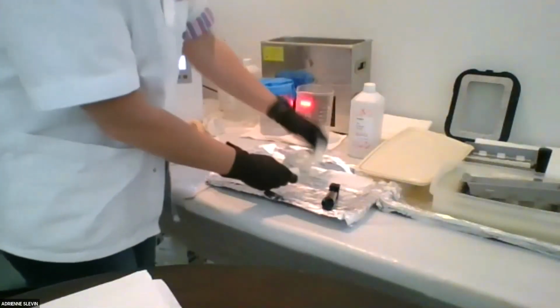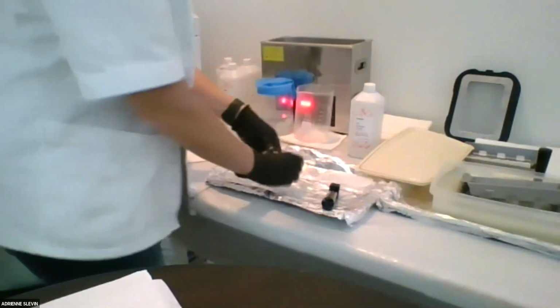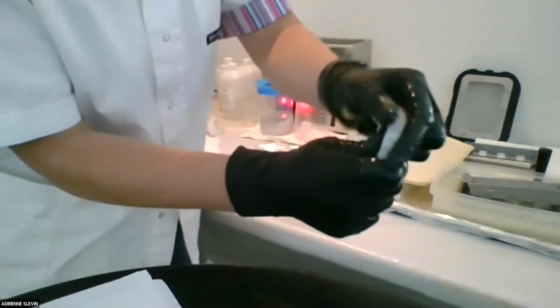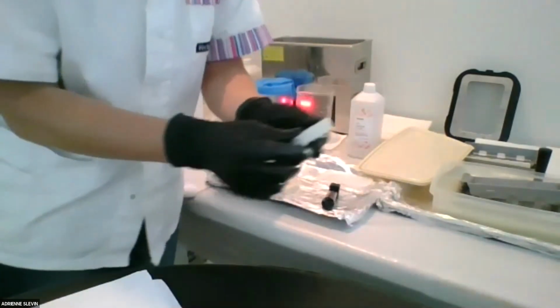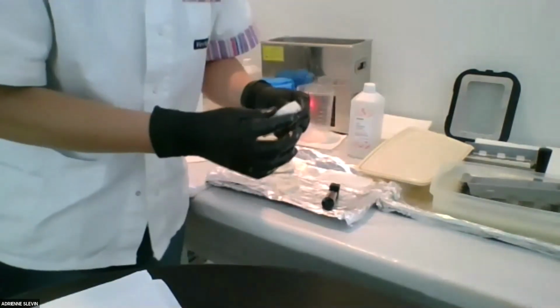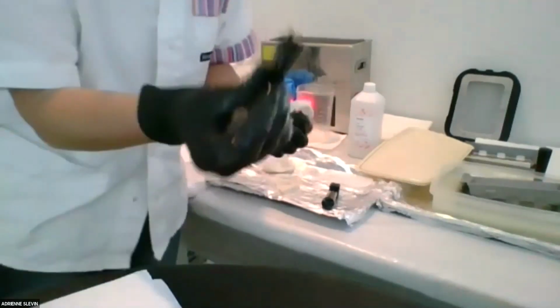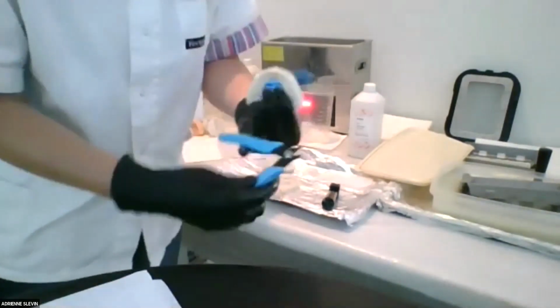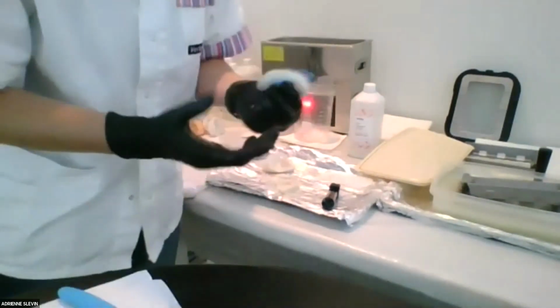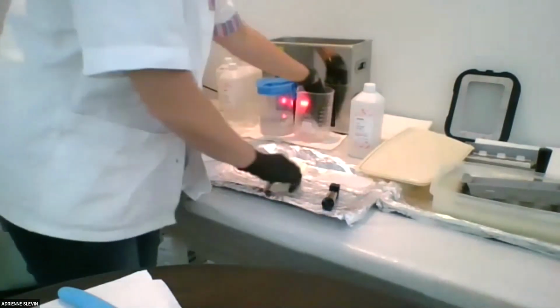So then after you do that, just put everything, don't mix, like, if I was doing model peach or something like that, I wouldn't put my bleach MFH in there, okay? So you can see, I'm just gonna pull these off, and you can see how easy these pull off. Now, if they don't all pull off, that's okay. And if you don't clean it right away, they're gonna get harder to pull off because they're gonna continue to cure, right? But I like to have some fingernail clippers or some snips, some very fine tip. And then you can just snip those right off after you clean the parts in alcohol. And then you don't have to recontour, which is really quite convenient.